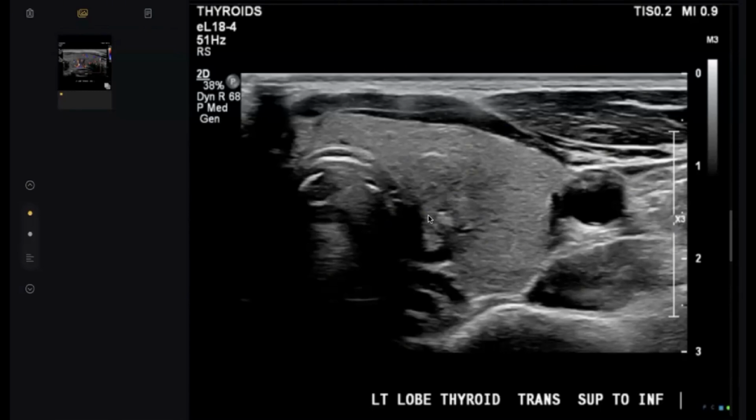See my colleague, this point is very important. The thyroid cancer that in its nature causes calcification in the lymph nodes, or is most associated with calcification, is the medullary. But because the papillary is very common, most of the calcification cases are related to the papillary. Despite the papillary itself not being the commonest cause of calcification. Is it clear?